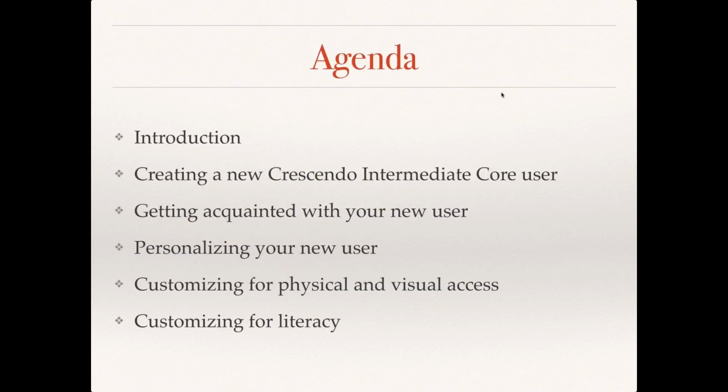So here's what we're going to cover today, or what I'm going to try and cover. This is the introduction. We're in that right now. And then I understand that a lot of the folks who are following the webinar already have Proloquo2Go, and they already have a user that isn't necessarily a core word user. And so there's a lot of concern over how do we switch over to a core word user. So I'm going to walk you through that process.